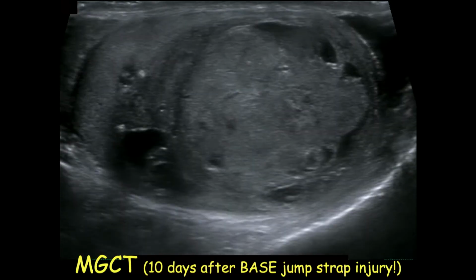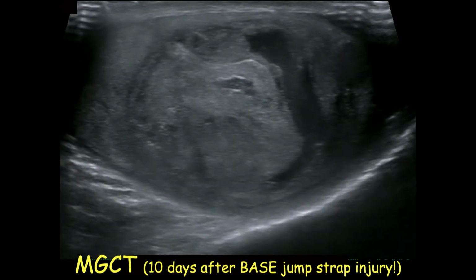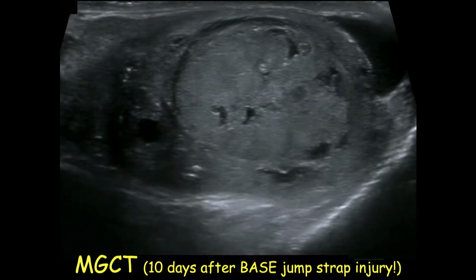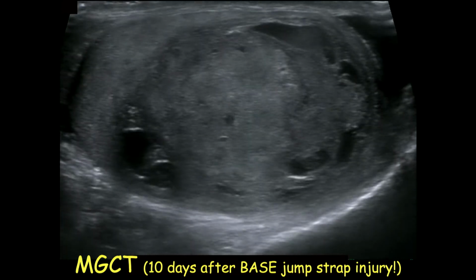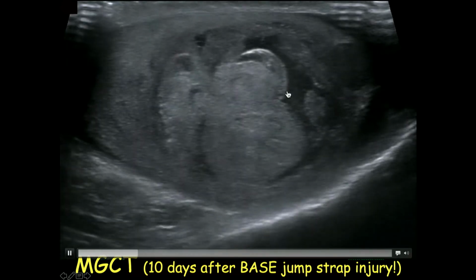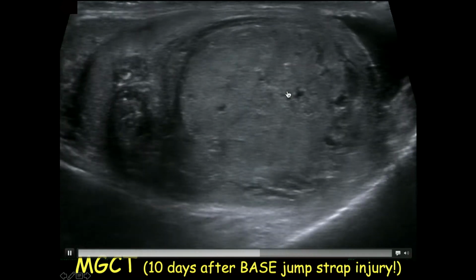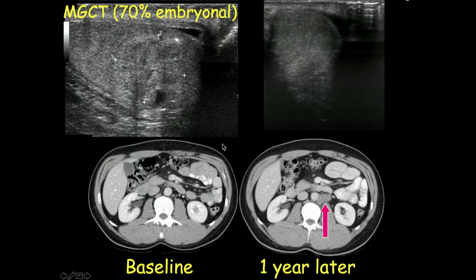We get some interesting sports out in Utah. There's something called base jumping, where they jump off of buildings or bridges with a parachute. And this guy's parachute strap kind of caught him in the balls there. It was a good thing that he came in because we diagnosed his mixed germ cell tumor following jumping off some cliff somewhere. Another case, mixed germ cell tumor, pretty easy thing to diagnose.